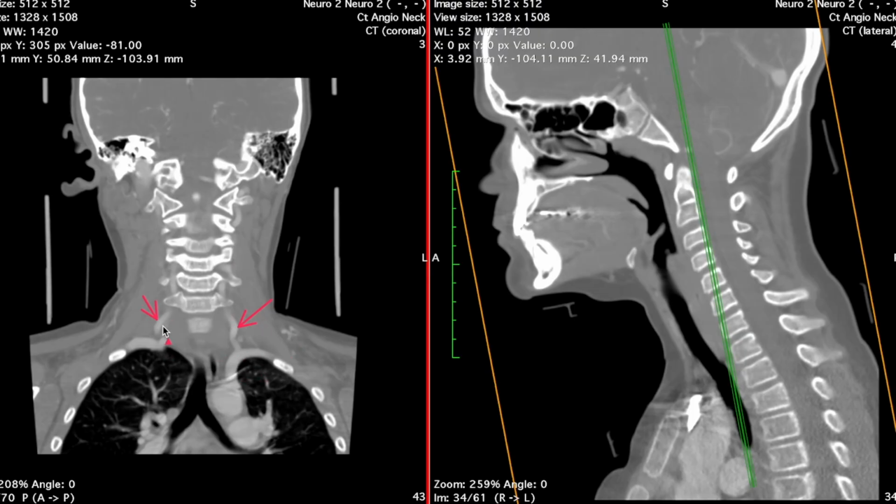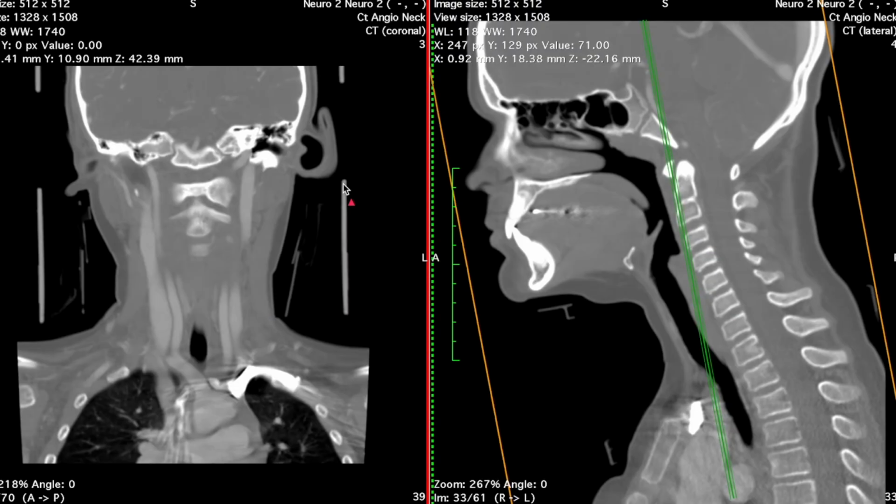You can kind of see it here on the right as well. That's the right vertebral artery, and this is the right subclavian artery. So that's a really good picture to show where the vertebral artery is originating from. The next thing I'd like to do is go back and talk about the common carotid artery and trace it as it ascends to the head and the face.